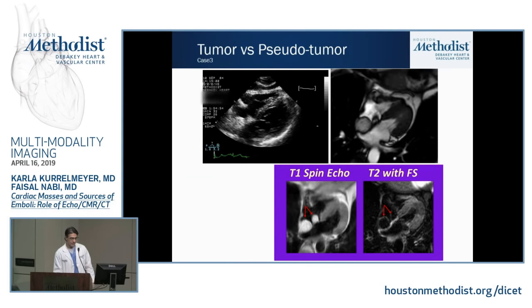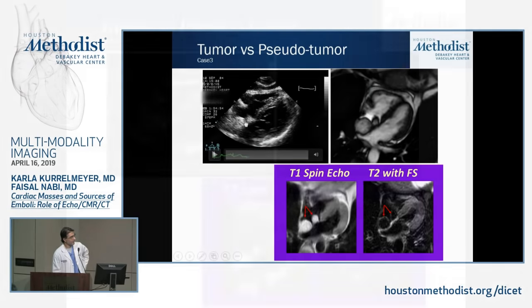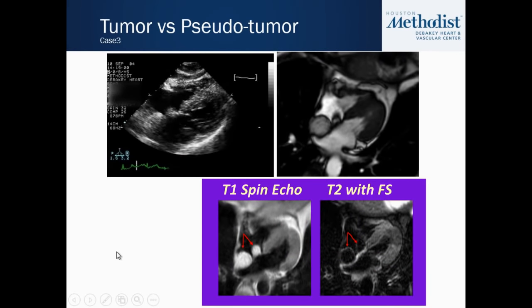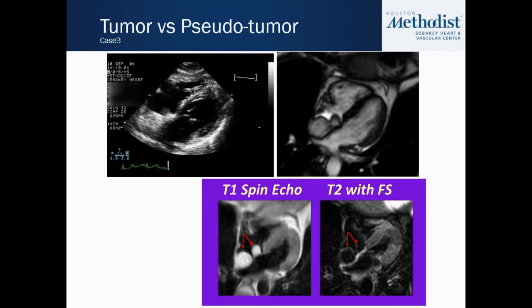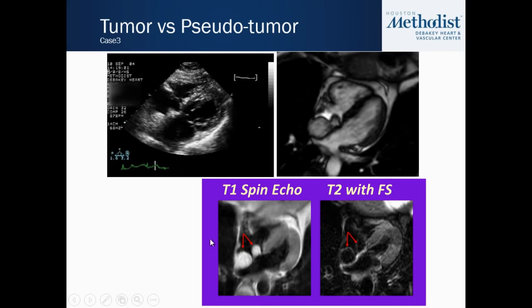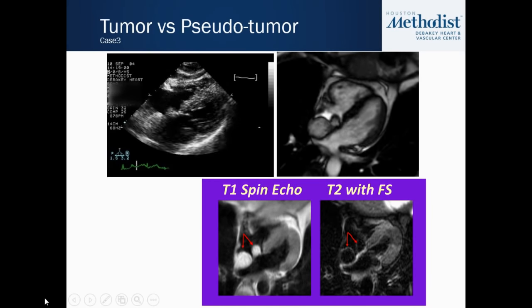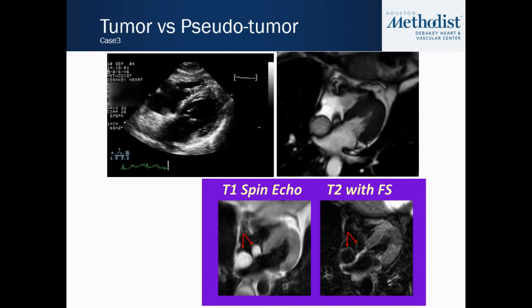So how do we do that with CMR? Here's a structure by echocardiography. The astute echocardiographers, of course, know the diagnosis right away. This is a dumbbell-shaped structure that's echogenic. It seems to spare the fossa ovalis. And this is exactly what you see with CMR as well. But what CMR allows you to do is really probe what you're looking at.